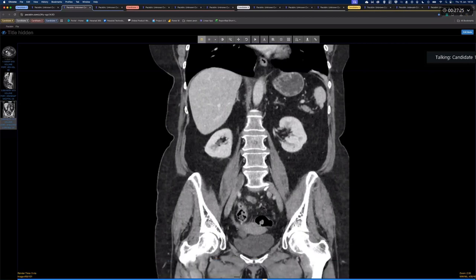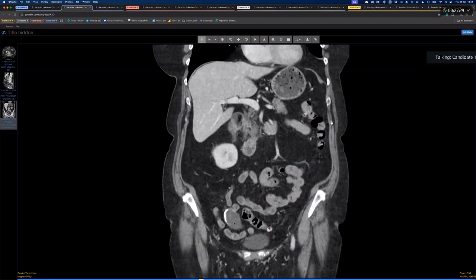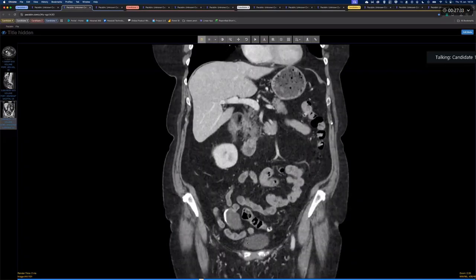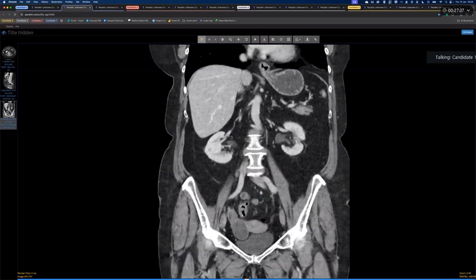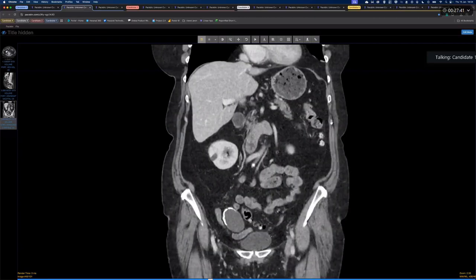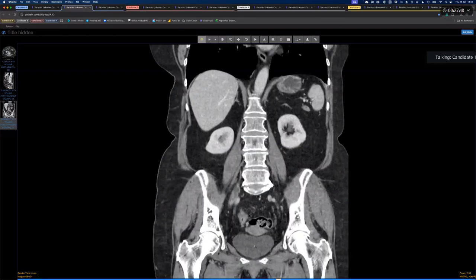It could be representing a fallopian tube rather than an ovary. Again, there is no internal enhancing soft tissue component. I think this is another calcification. So my thinking is about hydrosalpinx, or it could still be an ovary.